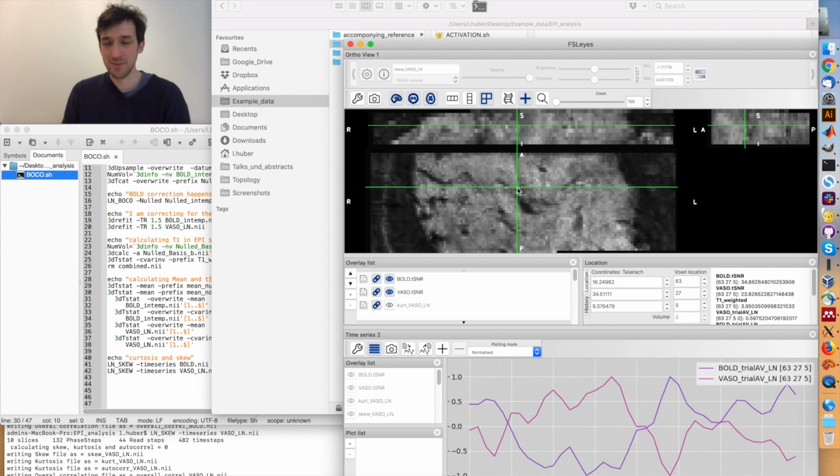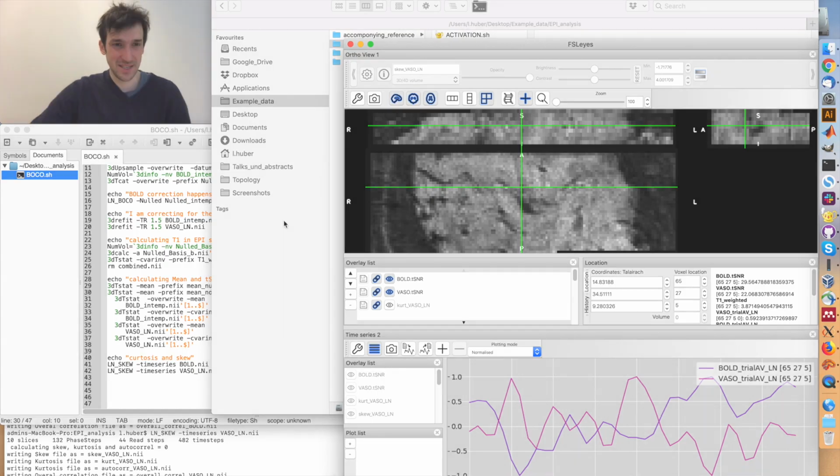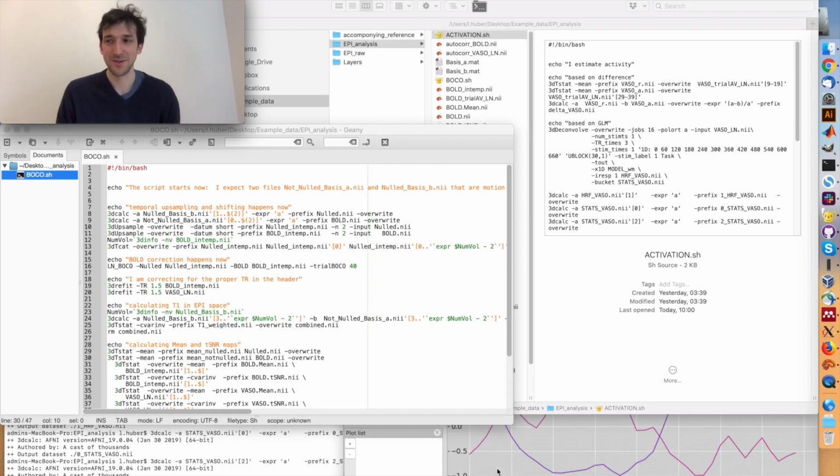Usually my rule of thumb is that you should be definitely bigger than 15. If it's bigger than 20 for VASO, it's also advantageous, but sometimes we cannot do that. So this is all right. And this also comes from the fact that we use thicker slices, not isotropic submillimeter voxels. In motor cortex, it is easily doable to use these thicker slices because you can align the slice perpendicular to the cortex. So you still have layer-dependent specificity, BOLD correction, and also some basic quality assurance.